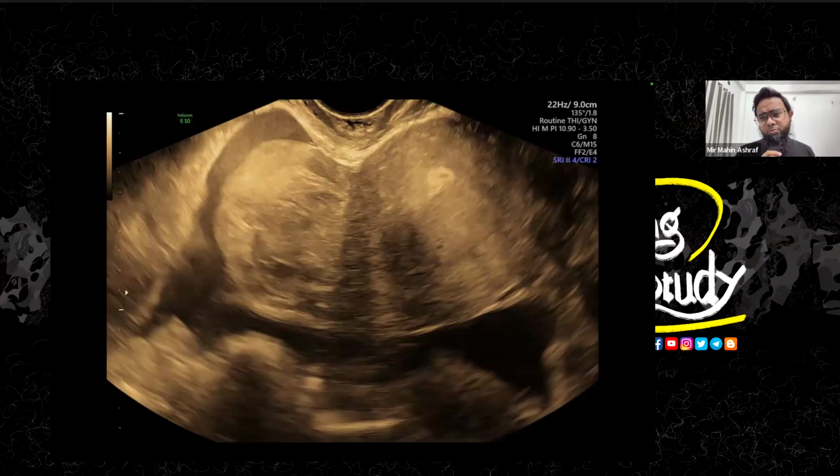It's easy to differentiate between oophoritis and torsion. Oophoritis and torsion both come with a large hypoechoic ovary, but on grayscale you will see the echogenic margin of the follicles, which is called the ring sign, which is definitive for ovarian torsion. And in case of oophoritis, you won't see this feature. There will be some collection, enlargement, fat thickening, all may be present in both. But in case of torsion, you will see no vascularity, or you may also see high vascularity definitely at the peripheral part, but the central part usually has no flow.